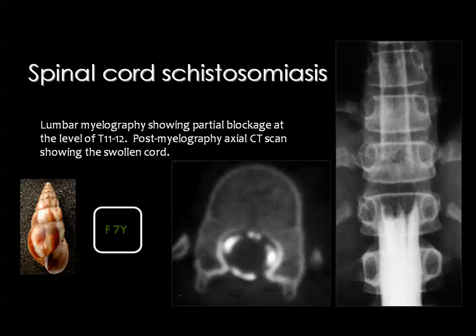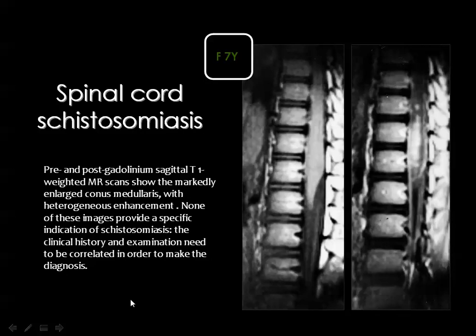And of course, there are a lot of manifestations in the clinical picture related to involvement of the conus. In the old imaging, before the era of MRI, we used to do contrast myelography of the dorsolumbar region, and to support this by CT myelography. And you can appreciate that the conus is swollen, and here also you can see that the conus is swollen as indicated by attenuation of the contrast column around the region of the conus medullaris.